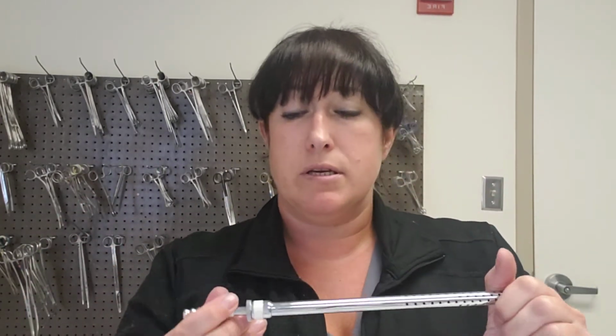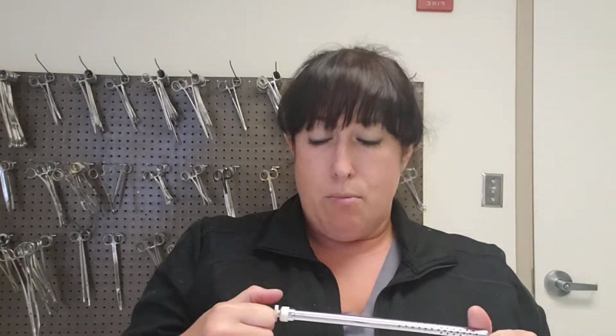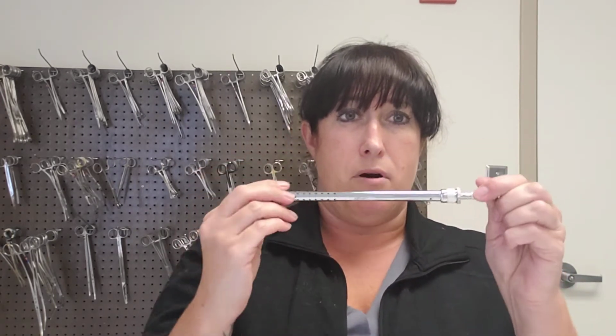Another time you might use this is towards the end of a case. Oftentimes with open abdominal procedures, before the surgeon closes up, but after they are done with whatever they're doing, they will pour warm, sterile saline into the abdomen and wash it around to make sure they're cleaning it out, and also making sure they don't have leaks and that there's not other debris. But they don't need to leave that saline in there forever. So you will switch out your suction tips from this to this briefly until they're done washing the abdomen, and then you're done. So this comes apart.